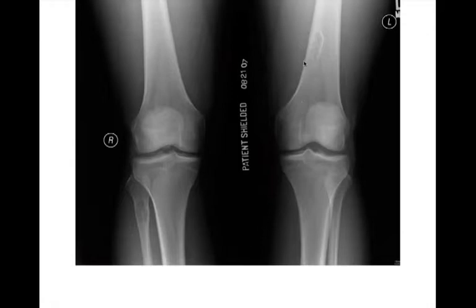This is another one, so we'll take this lesion right here to describe it, even though there's another one right here and probably another one right here. So geographic lytic lesion, narrow zone of transition, sclerotic border, which is eccentrically located in the metadiaphysis of the distal femur. There's no periosteal reaction. There's no pathological fracture. Typical appearance for a non-ossifying fibroma, right?